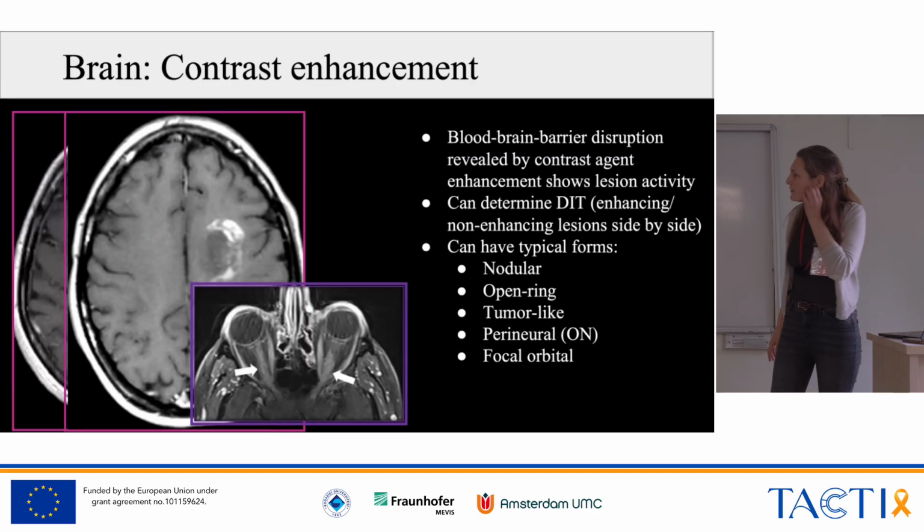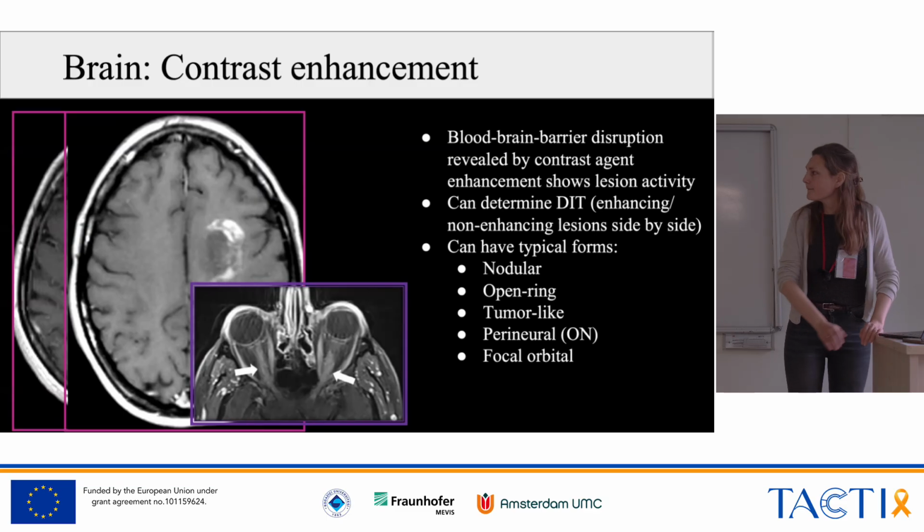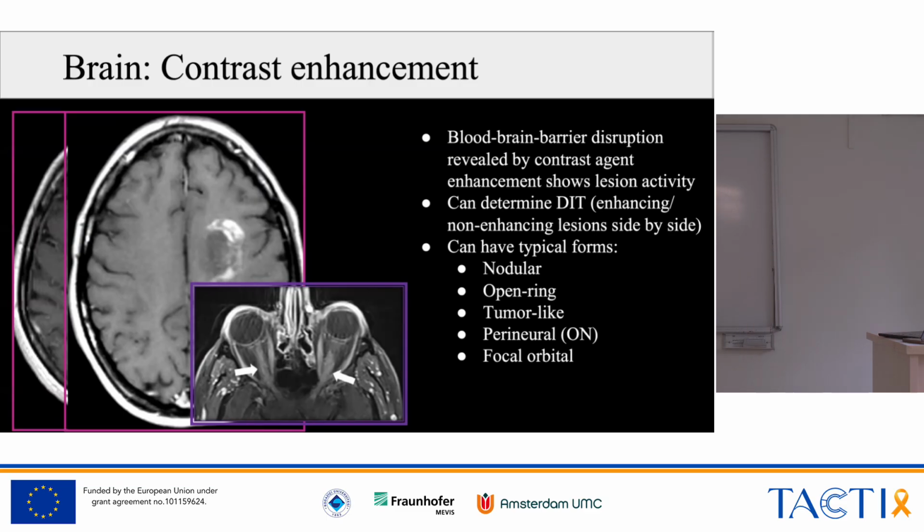And for the optic nerve, it gets more complex again. If you have post-contrast optic nerve images, you have to make sure whether something is inside the optic nerve, which would be MS typical, or if it's more paraneuritis, which would speak a little bit against MS. Vera, where is the lesion in the optic nerve? I cannot really see. Is it the black spot? So this thickening here is in fact paraneuritis. So this is around the optic nerve. Okay. And here it's much smaller, inside the optic nerve. So the optic nerve post-contrast is very difficult.